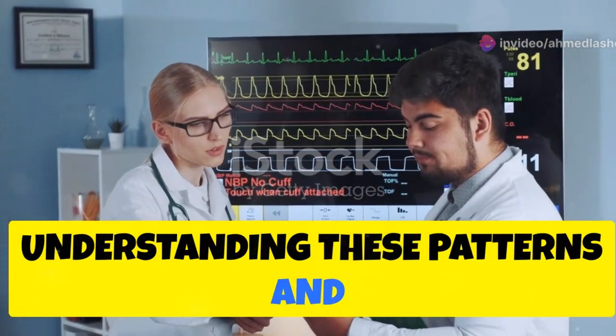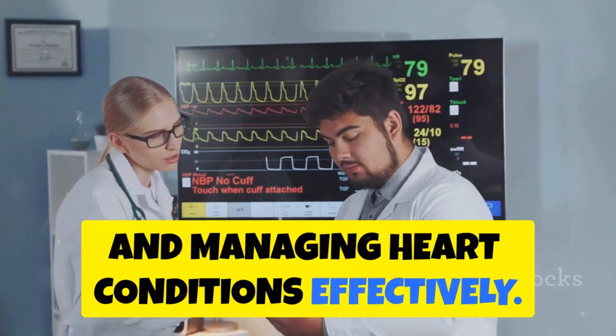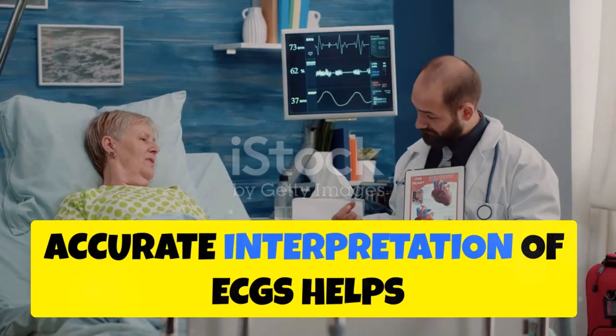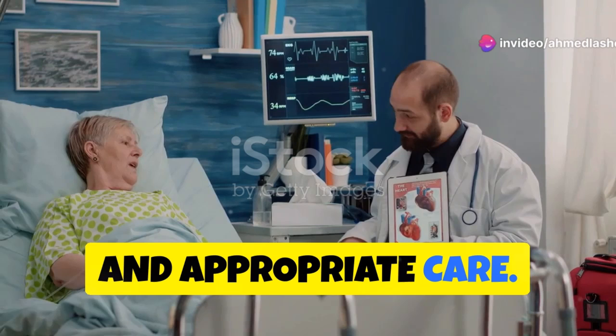Understanding these patterns and abnormalities is crucial for diagnosing and managing heart conditions effectively. Accurate interpretation of ECGs helps healthcare professionals provide timely and appropriate care.